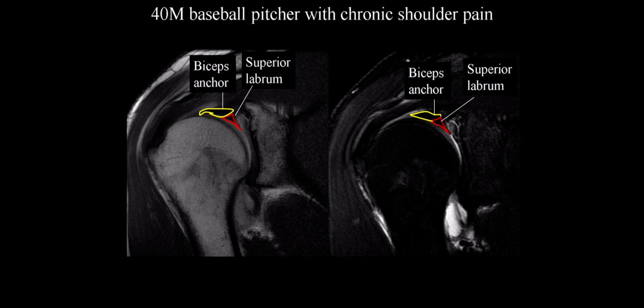It's not snugly up against the glenoid. So this should be, if you compare it to the inferior, look at the cartilage. There should be a seamless interface between the cartilage and the black triangular labrum. As you go up here, it's nowhere to be found. It's displaced about a half centimeter laterally from where it should be. So the biceps anchor is still snugly attached to it, and you want to look at that relationship as well.